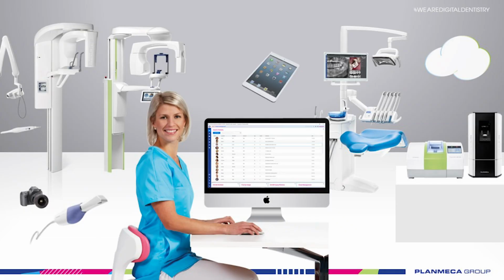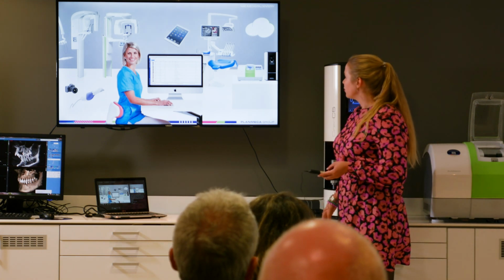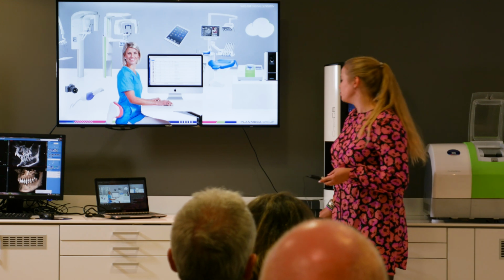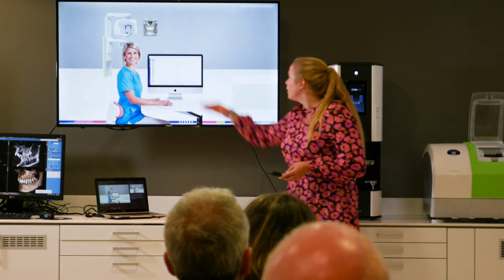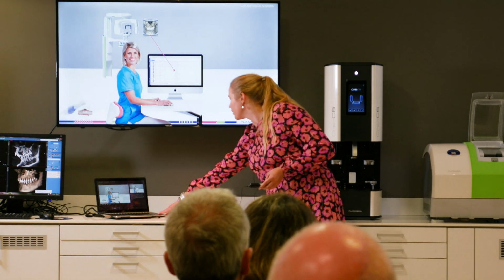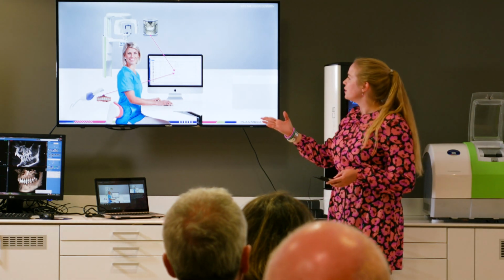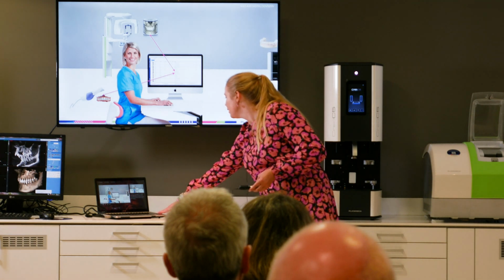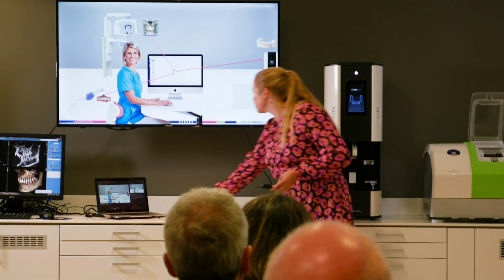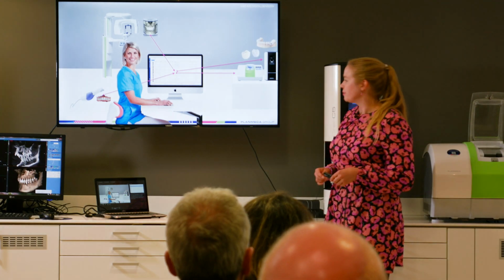So now that we have built this kind of clinic, whichever amount of devices we have there, let's see what we can do with this flexible system. Let's take a look at a couple of digital workflows that we can do with this setup. Firstly, if we take a look at implantology, we would like to have a CBCT image and then an intraoral scan, so that besides bone, we can also see the soft tissue outline, and especially if we would be interested in making a surgical guide, we would need to have a dental scan as well. And those surgical guides we could send to a 3D printer, and then when it comes to the restorations, we could make them with our milling machine, for example.